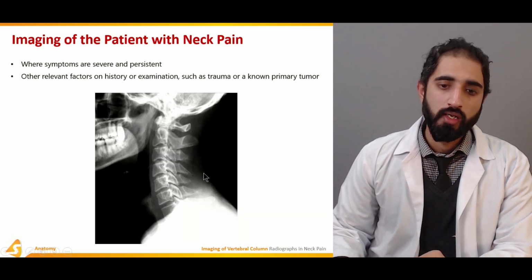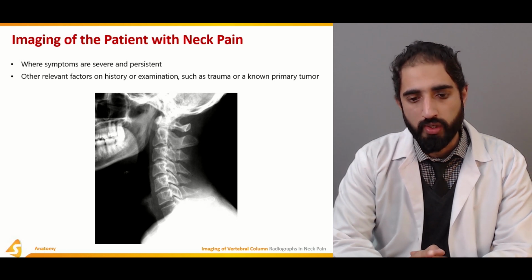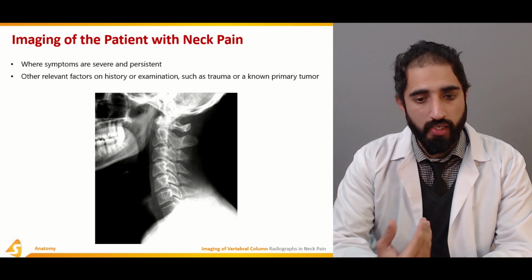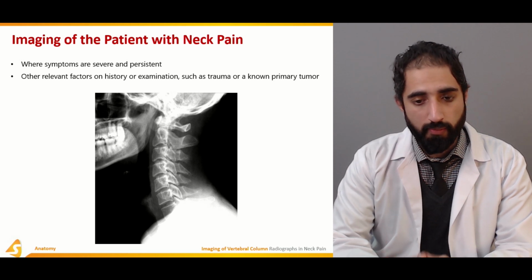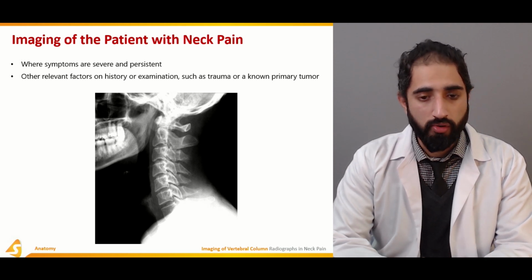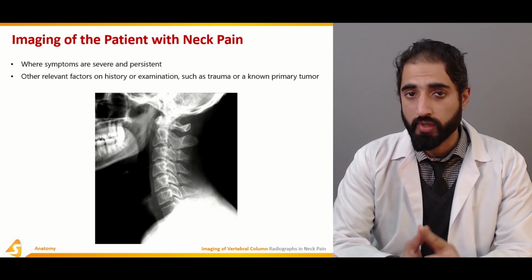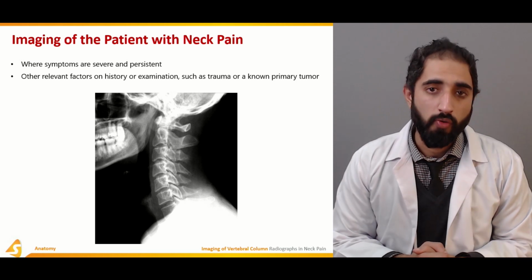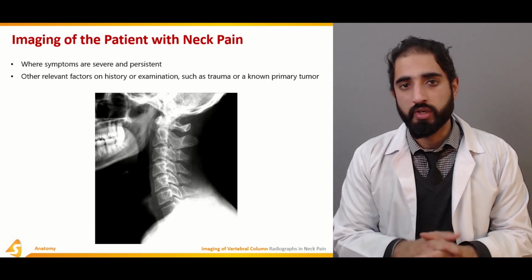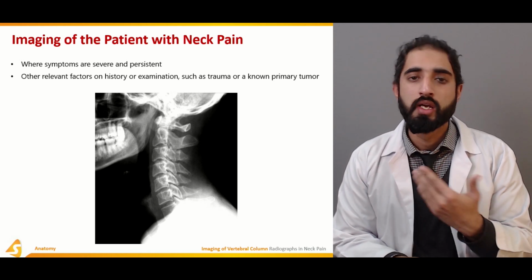And this here is actually imaging of a patient with neck pain, and in this we can look for different structures such as the intervertebral joints, the facet joints, the vertebral bodies, the articular pillar, and the spinous process. We can look for all of them, and you can also look at the biomechanical components such as the posterior longitudinal angle and the craniovertebral angle in terms of the straightening of the cervical spine or the cervical lordosis.